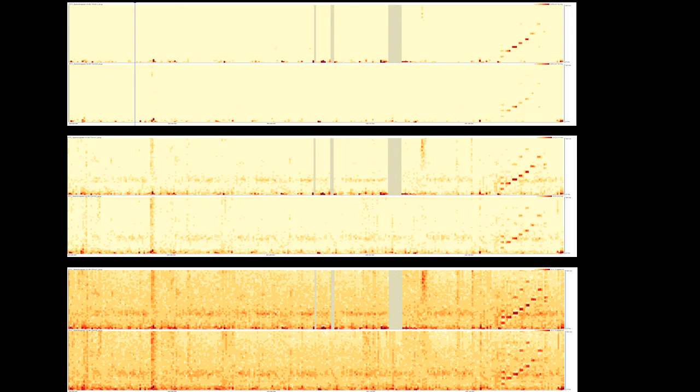Using the yellow, orange, red color scale, here are the 3 options for z-axis scaling shown side by side. The microvolts squared scale is shown on top, the microvolt scale next, and the square root microvolt scale on the bottom. For most clinical work, I prefer the bottom square root scaling because it imparts more dynamic range to the depiction of EEG activity, and it jibes better with my visual impression of the raw EEG.